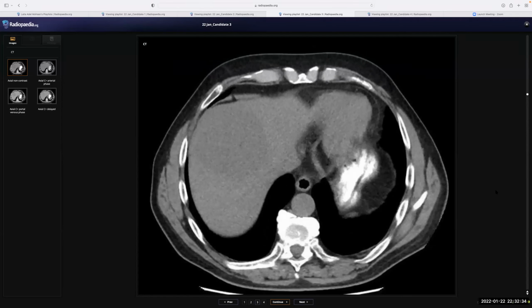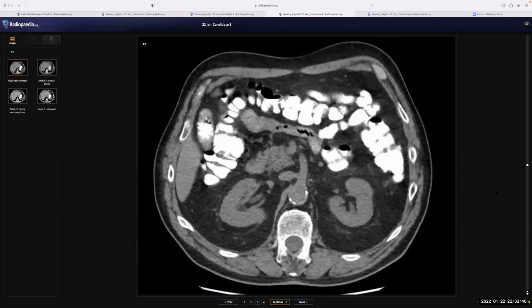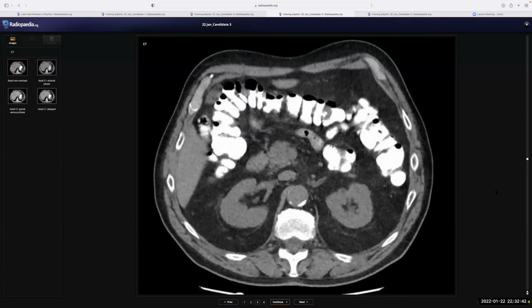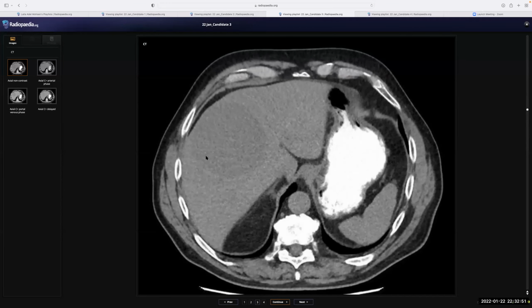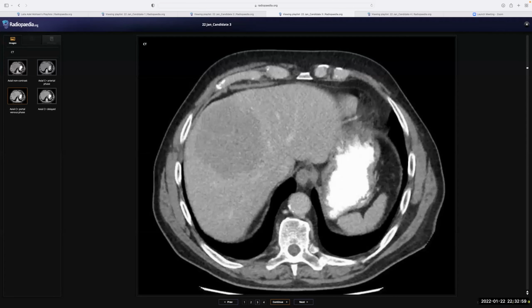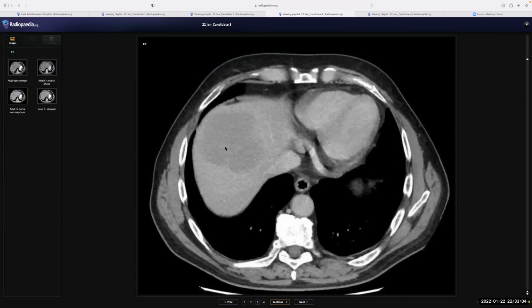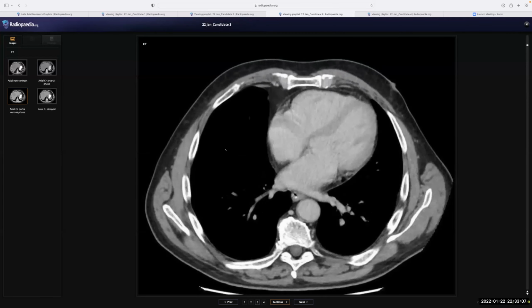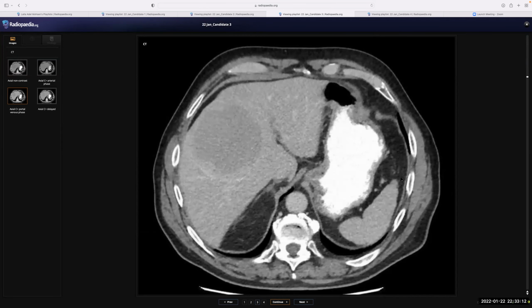The oral contrast material is there, but the lesion is not enhanced, I think, non-enhanced. So if possible, I would like to see the enhanced CT just to be sure of the nature of the lesion. Yes, sure. Well, there is mild septation within the lesion, which is mildly enhanced.